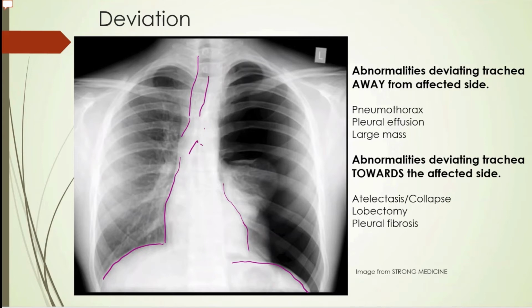And then E for everything else. We look on the right-hand side and you see good lung markings all the way out. But you look over here on the patient's left side and you see really no lung markings. See, there's no vascular markings here anywhere in here. And this is a really easy one to pick out. Some pneumothoraxes aren't. And this one's, again, a tension pneumo because it is pushing the trachea and the heart over to the patient's right-hand side.